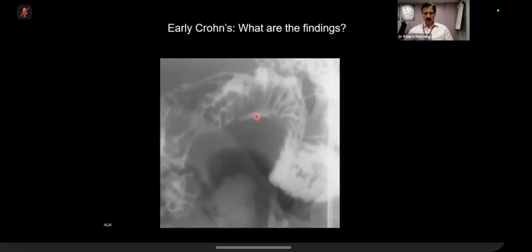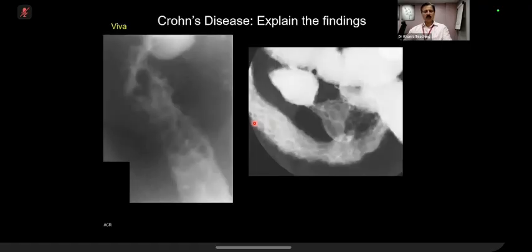Actually, this is an ulcer, and the mucosal folds are radiating towards it. It's a deep ulcer, just like a knife edge, a stab type of ulcer. With that comes this classical exam finding. Yes, candidate 8, how will you describe this? This is a classical exam finding.